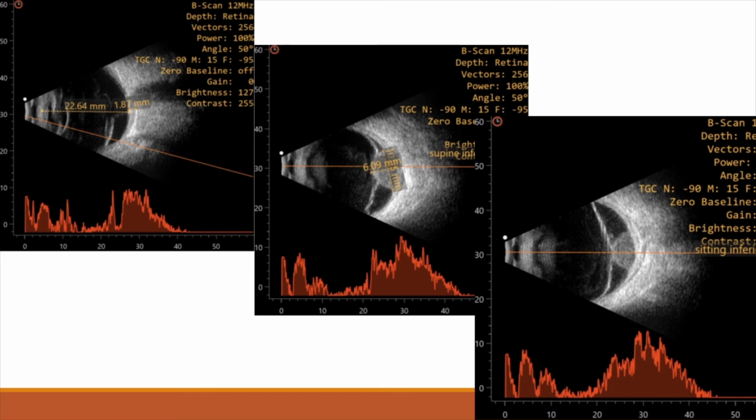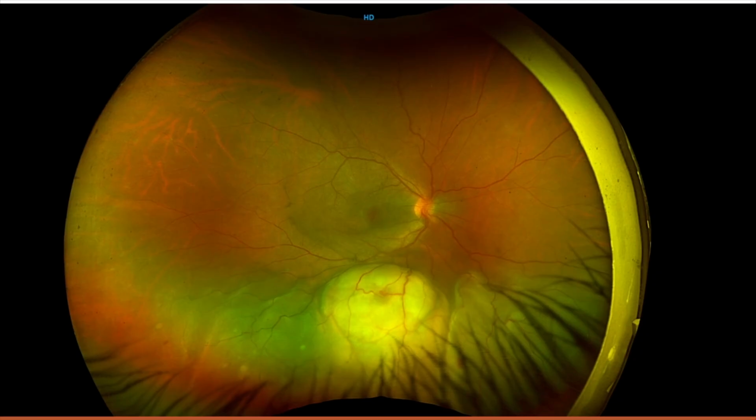Proceed. So this patient's diagnosis was a choroidal granuloma. And this is a fundus photograph. Doctors, this patient also had a history of abdominal TB 20 years ago. She was already treated once with ATT, and she is a healthcare professional. And on further examination, Mantoux was also strongly positive. HRCT was also showing changes.